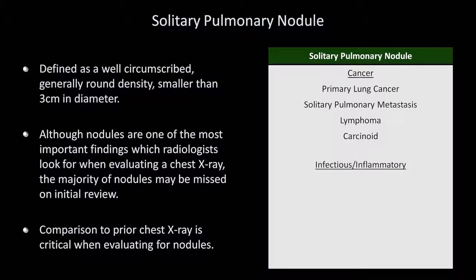Infectious and inflammatory causes include granulomas, which are typically very small, well demarcated, and calcified. They are consequences of prior infections such as histoplasmosis, coccidioidomycosis, and tuberculosis.